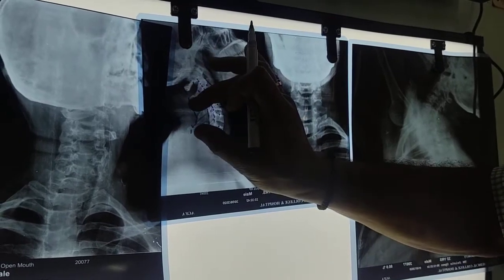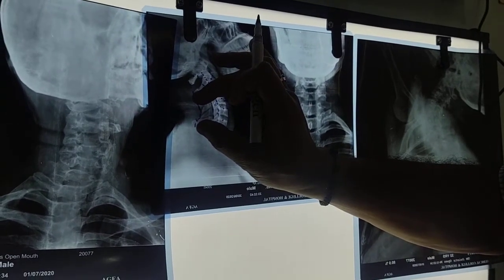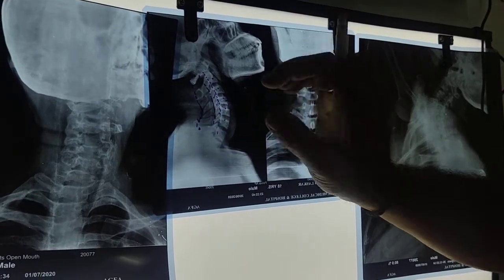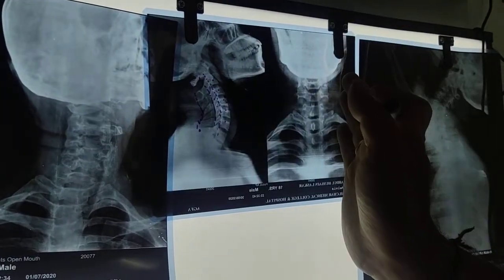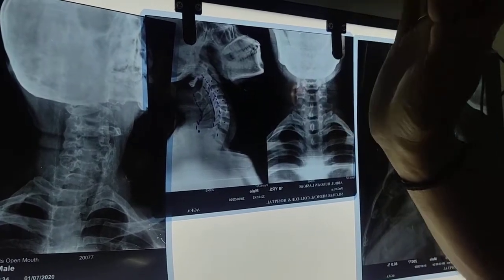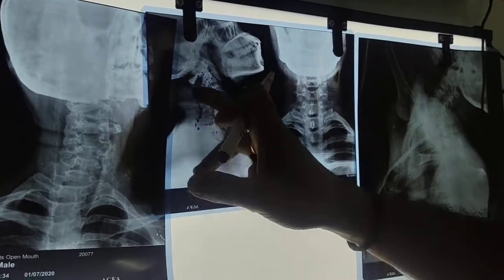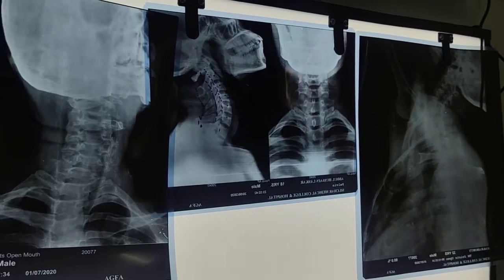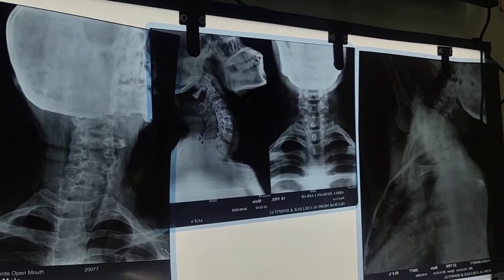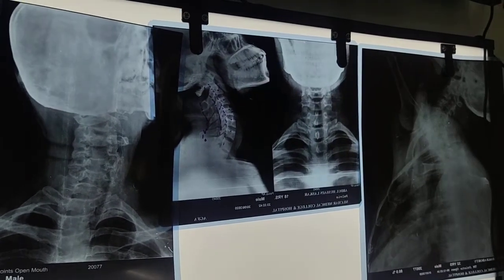There is a crowding of the bony spinous processes that leads to a fracture at the spinous process, but it comes back to the original position, with nothing anteriorly. So in the X-ray you will find only the fracture at the posterior spinous process, because the other bony component is not involved.